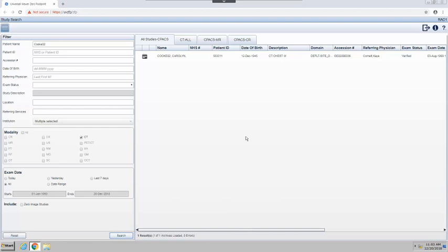ZFP also includes default work lists. Default work lists are dependent on the backend server for the system and are configurable by an administrator. In this case, we have 3 additional work lists available. You may change your current work list by clicking the tab.